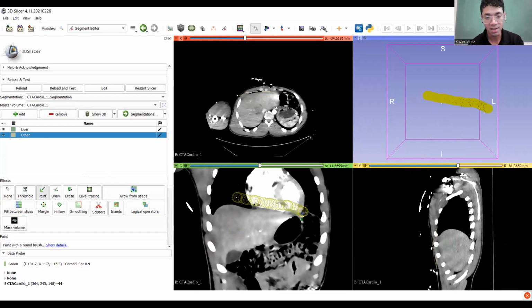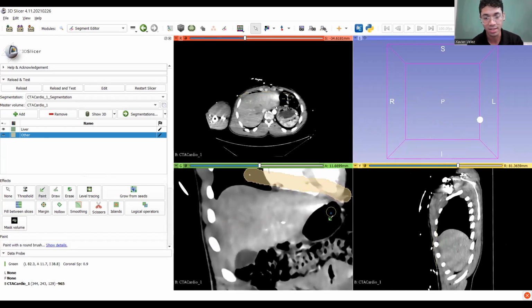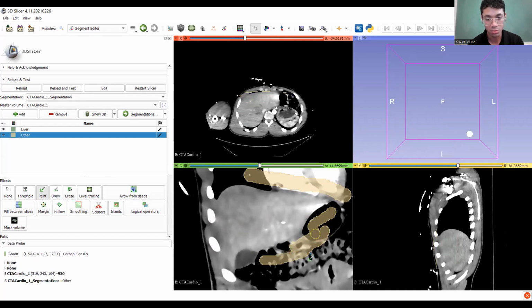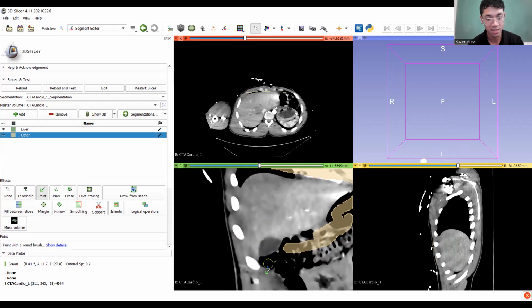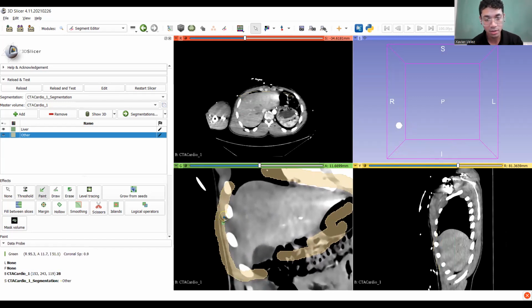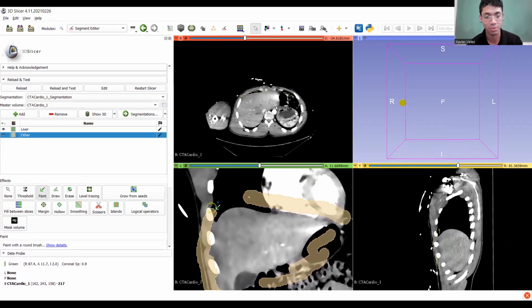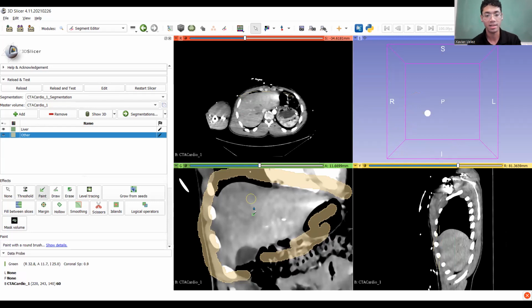So we definitely don't want that heart creeping in there. So I'm definitely going to put a big old line through that is not liver. And just all around there. We don't really want all that noise. Try to make it clean. Again, don't know what that is. I'm not going to touch it. And I might make this a little more clear that there's a line right here, like none of this bone stuff. None of that is, I don't even know if that's bone. Whatever that white stuff is, we don't want it. Get it out of here.